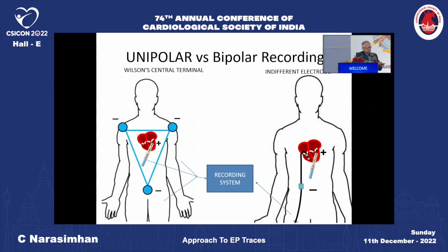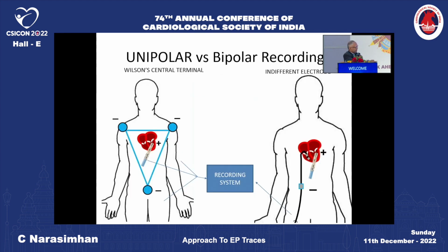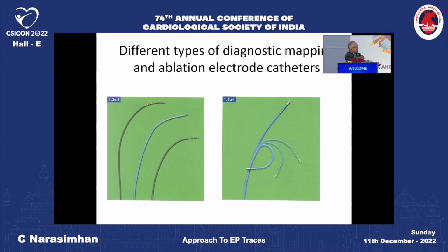What we do in the electrocardiogram or during an EP study is try to look at the electrical signals between two electrodes, just two electrodes which are 2 or 4 millimeter apart. Instead of looking at the whole electrical activity of PQRS, you are trying to see just underneath this electrode. For example, proximal electrode, distal electrode, what is the local electrical activation?